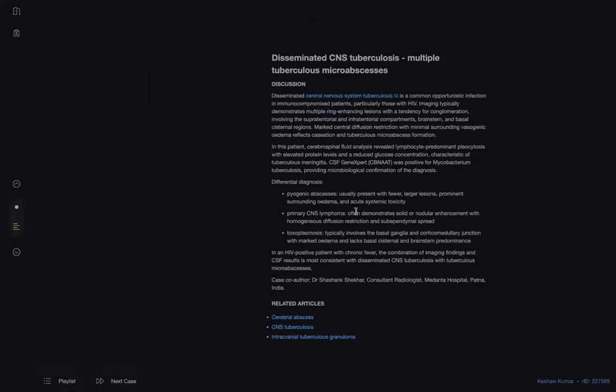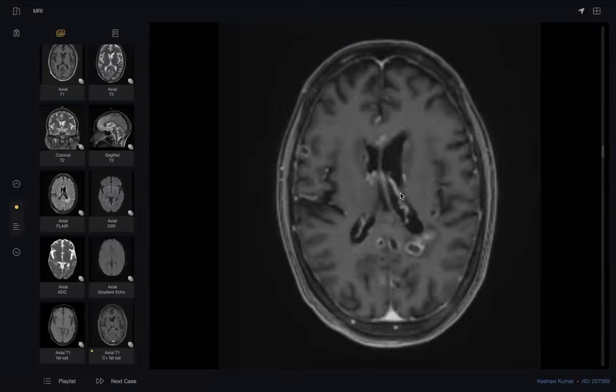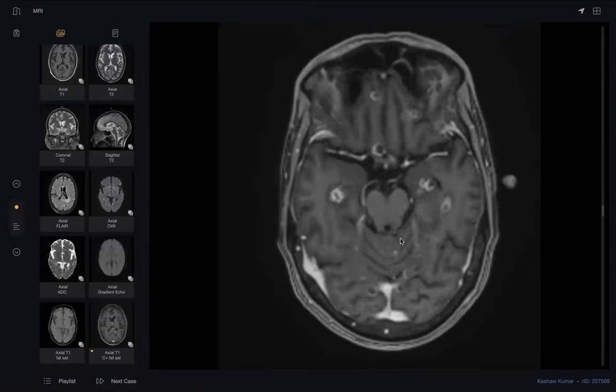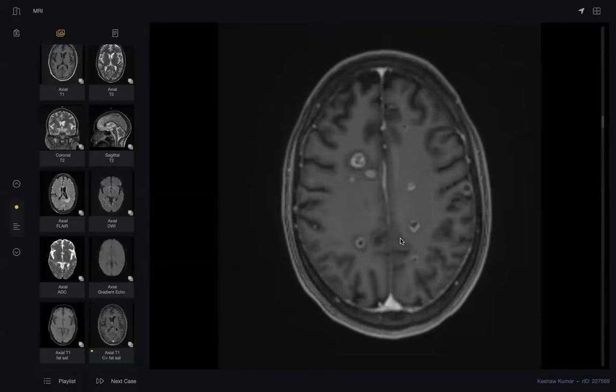See, the differential list in this widespread ring enhancement. This is the point. After the candidate asks for post contrast, now we are presented with multiple innumerable ring enhanced lesions with random distribution. This is very important, so you must enumerate the different diagnoses.